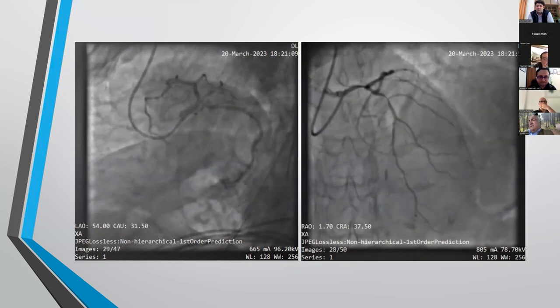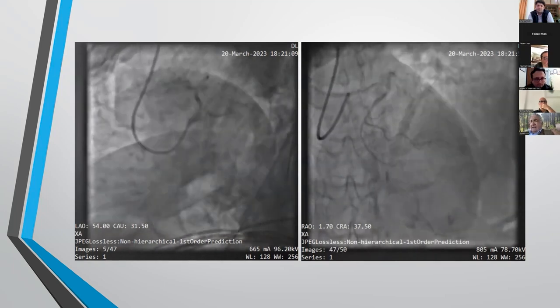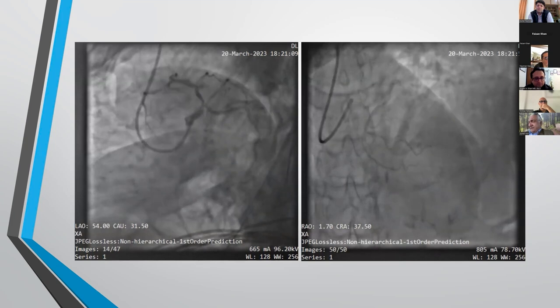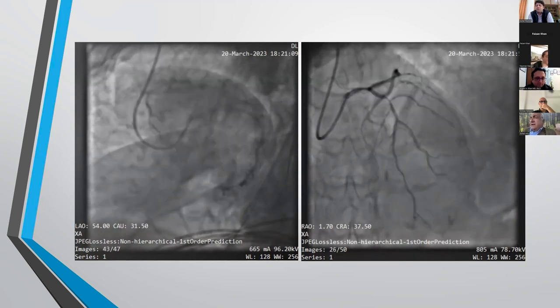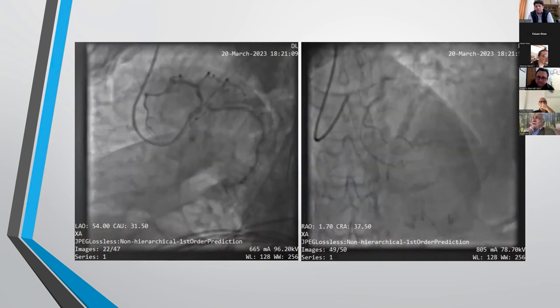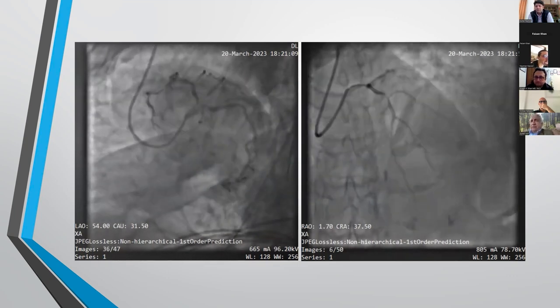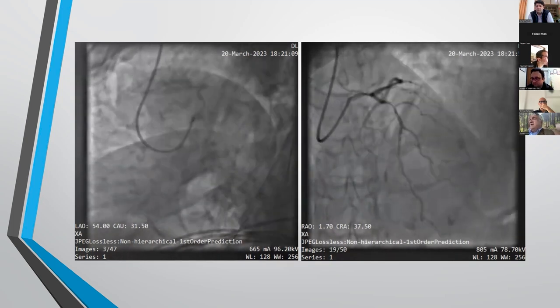And you always overestimate the result on an angiogram. When you do an IVUS, you find that you do get underdeployed stents. And I've seen that you use different techniques for left main stem. I'm trying to share the impression I had while looking at these cases. You can use any technique you like, as long as the IVUS shows a good result, whichever technique you use, probably like you've been using mini crush and so on, which is not a very trendy thing to talk about nowadays.